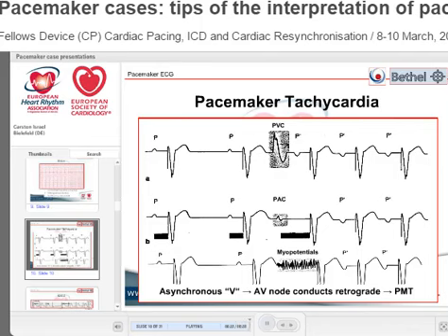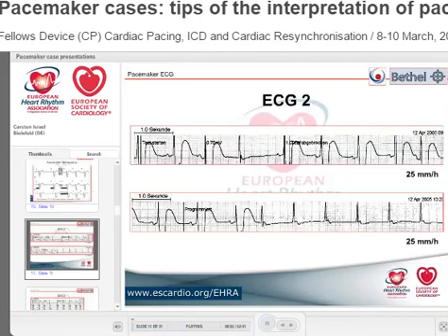Very, very nice. Now, this is a very funny ECG. One of my fellows was showing it to me and said, whenever I make a ventricular or atrial threshold test in this patient, he gets very dizzy, and I don't like the ECG, but I'm not sure what's going on. So this is the start of the atrial threshold test. Here you have 0.75, oh no, you have sensing, and then pacing, and it's very nice of that guy to stop it here. And then I took over and made the same test, and I was a little bit harder on the patient. He was lying down, so he can't drop down.